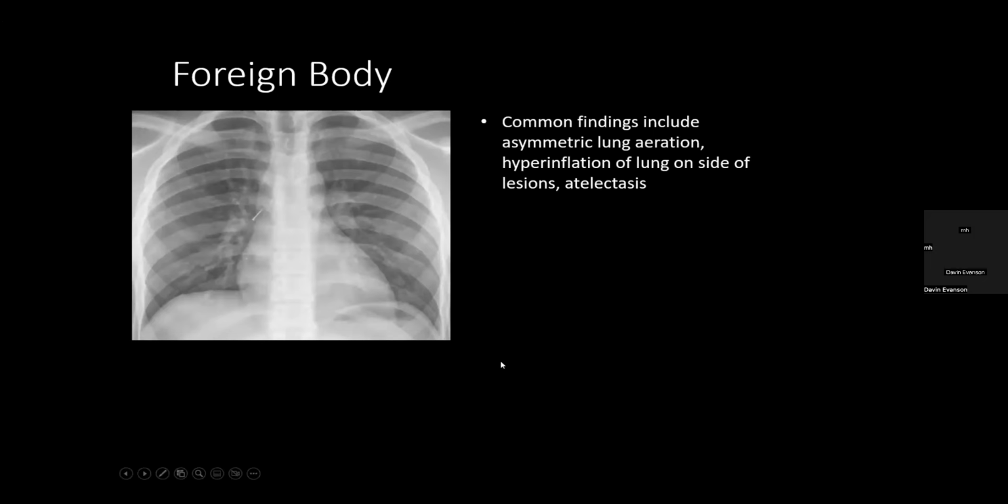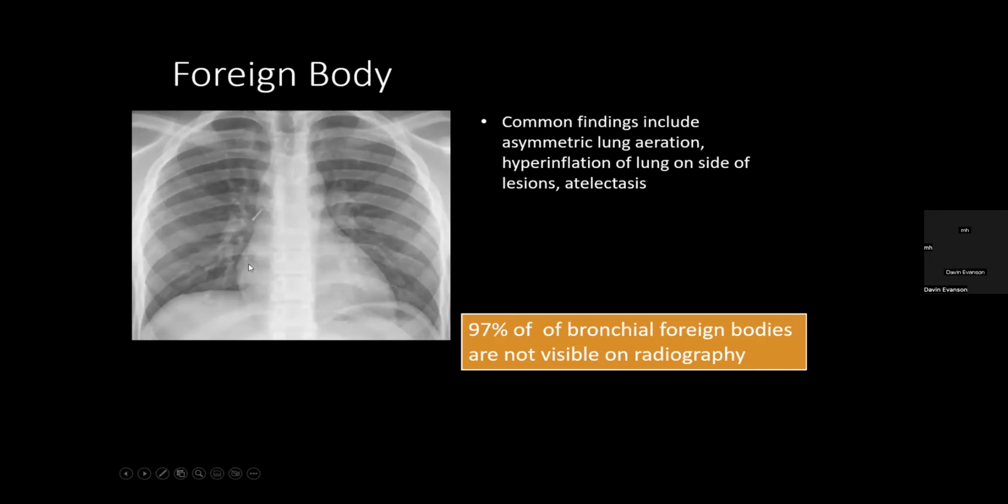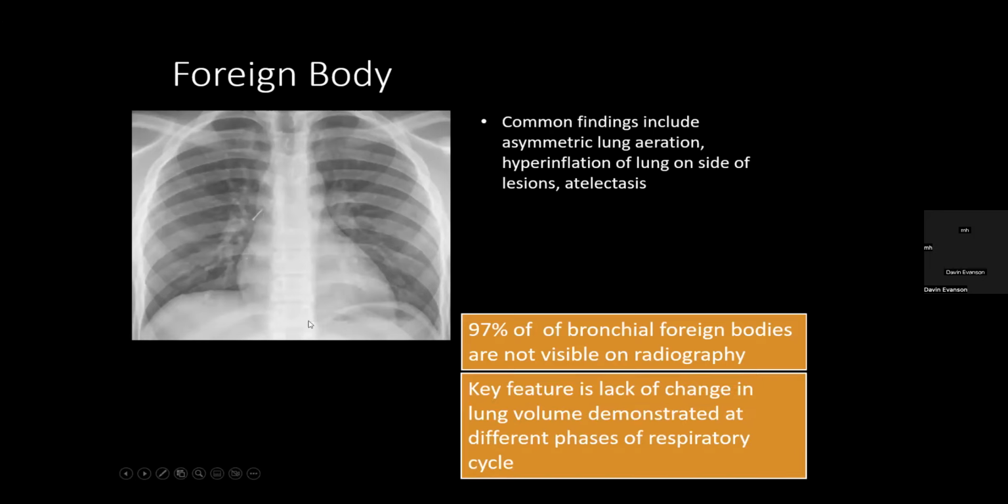Foreign bodies. So kids will eat anything. You see the foreign body here. Most of them are not visible on radiographs, but this one is.